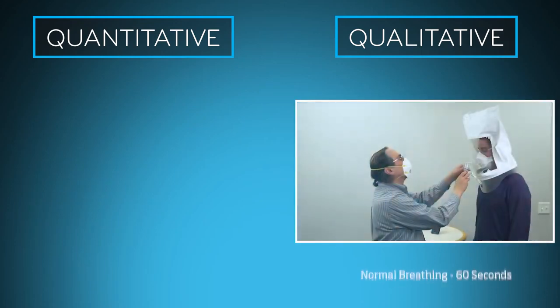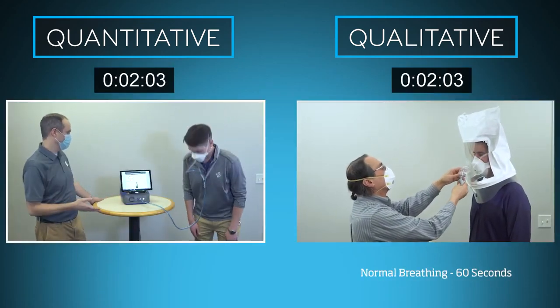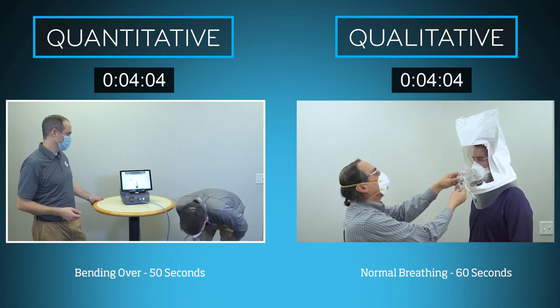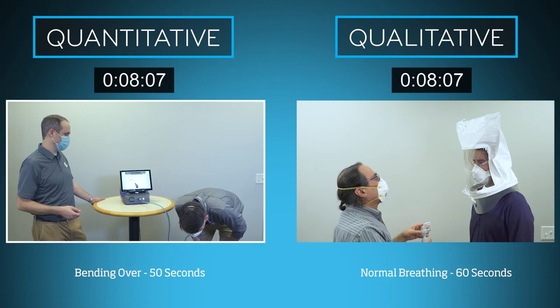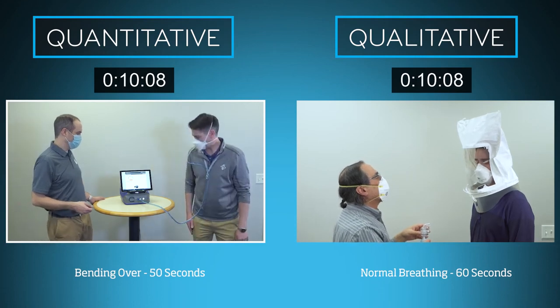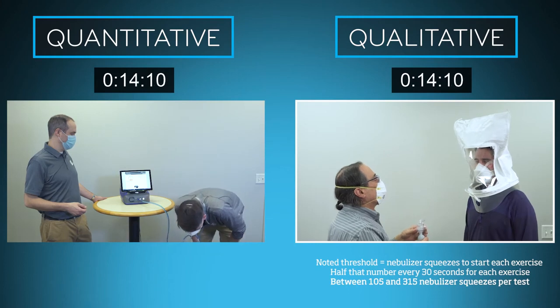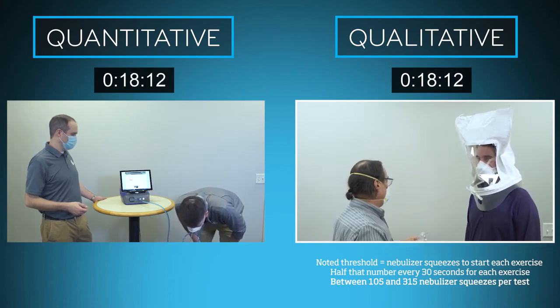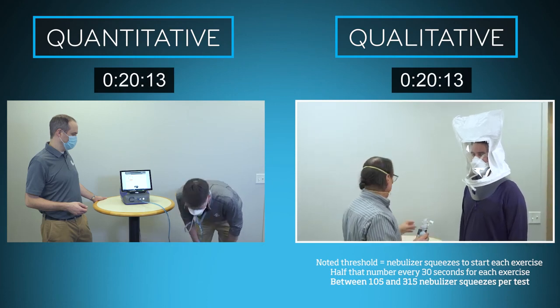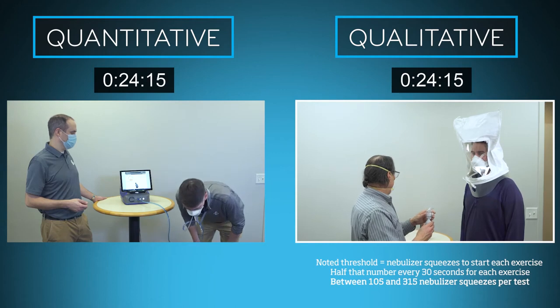For the qualitative testing method, the fit test starts with 60 seconds of normal breathing. For the quantitative method using the PortaCount Fit Tester, the fit test starts with 50 seconds of bending over and returning to an upright position, taking 2 breaths at each extreme. For the qualitative fit test, the number of nebulizer squeezes noted from the threshold or sensitivity test are introduced at the beginning of each exercise, followed by half that number of nebulizer squeezes every 30 seconds.